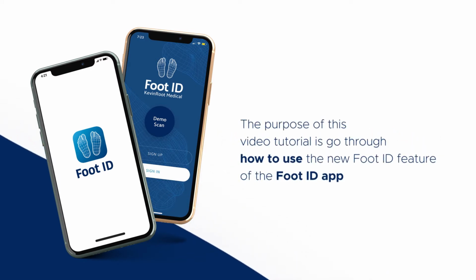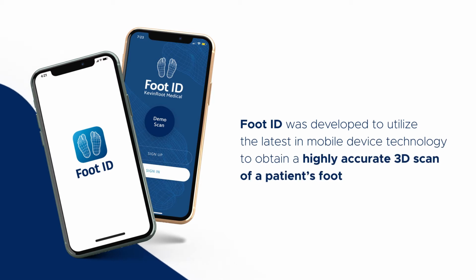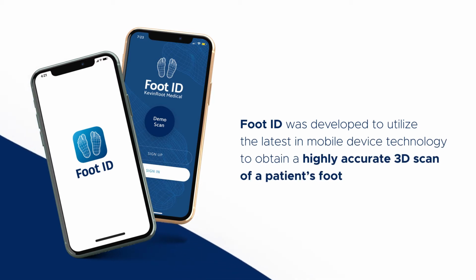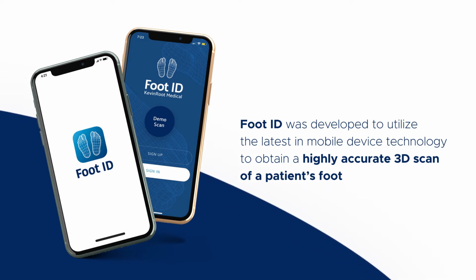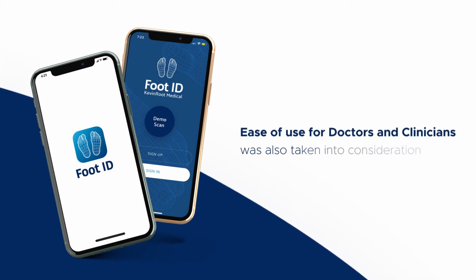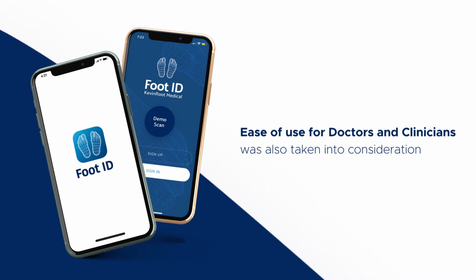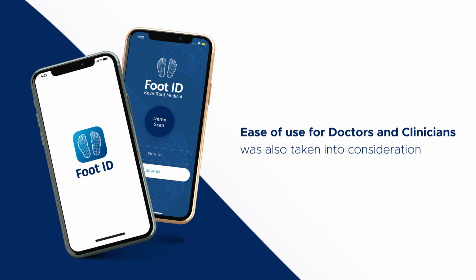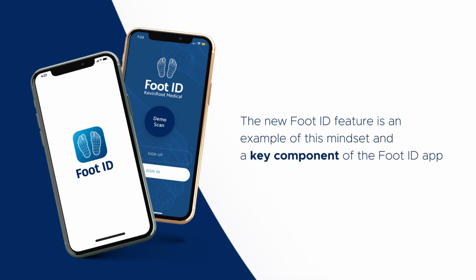The purpose of this video is to go through how to use the new Foot ID feature of our Foot ID app. Foot ID was developed to utilize the latest in mobile device technology to obtain a highly accurate 3D scan of a patient's foot for doctors and clinicians. Ease of use for doctors and clinicians was also taken into consideration in the development of Foot ID. The new Foot ID feature is an example of this mindset and is a key component of the Foot ID app.